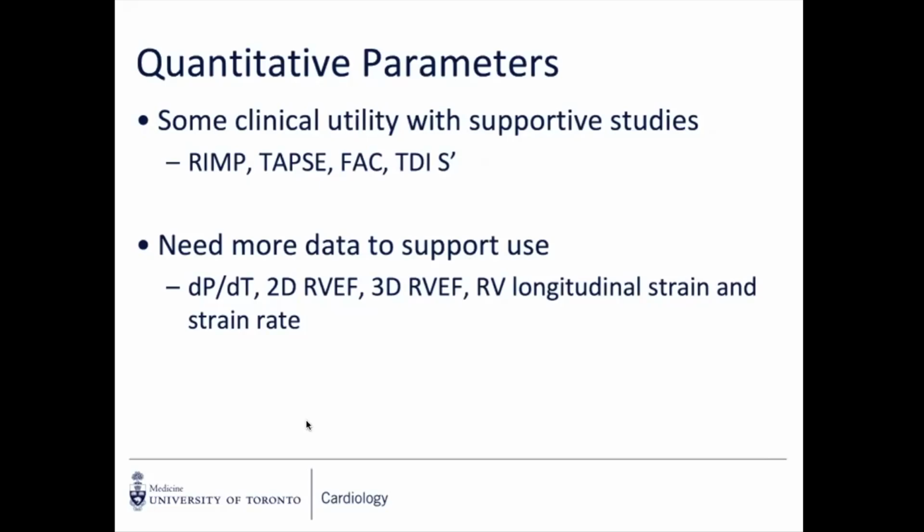Sometimes we see isolated, dilated RV outflow. We never really reported that, or we don't report that. Yeah, it's pretty uncommon actually. Practically, if you see the RV dilated on the parasternal long axis, it's a standard view. It's not a low parasternal view.